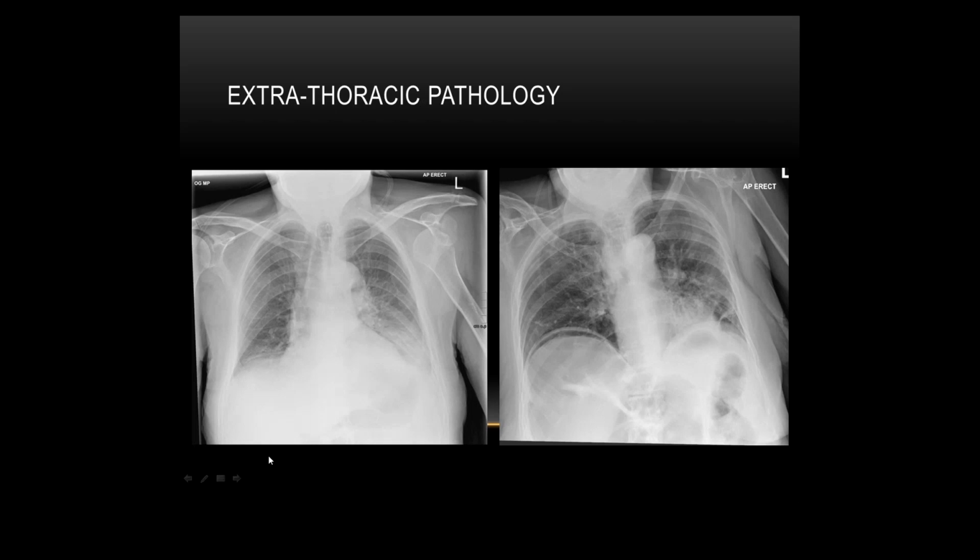Exactly. So as I was talking about earlier on, always look in your shoulder girdles, because you can see they've got a left glenohumeral joint dislocation. Typically, if you look at your right one here, it should be sat within the glenoid, but on here it pops out and it's slipped in just underneath the coracoid. So that's an anterior subcoracoid dislocation.